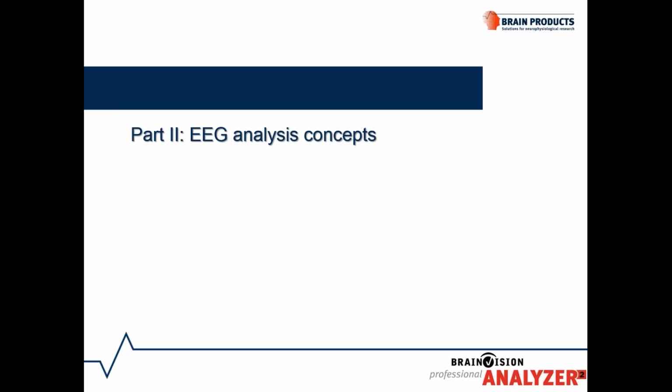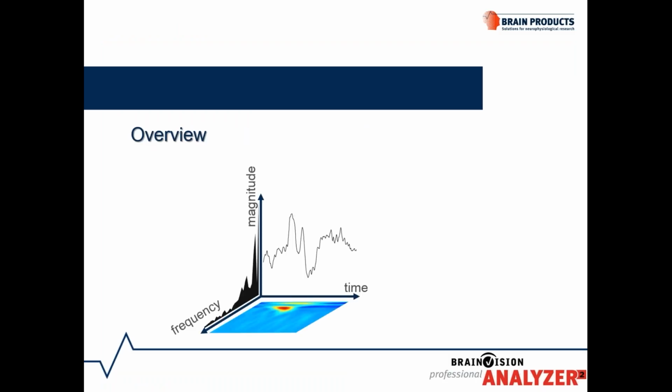In part 2, I would like to give you an overview of the most basic concepts in EEG analysis to get a better idea of which way to go when you start analyzing your data. The reason why people may get lost in the very beginning is because of the complexity of the time signal itself.